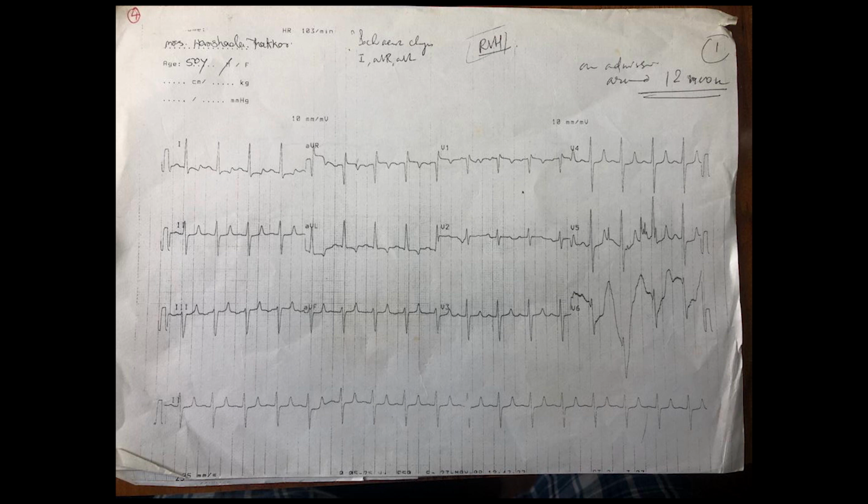negativity is more than positivity. So AVR negative is at plus 30. The pointer at minus 60 will tilt toward AVR a little bit, because AVR negativity is slightly more than positivity. So it will be less than minus 60. The axis would be around minus 45 to 50. That again is left axis deviation. The cause of left axis deviation in this case is left anterior hemiblock, or left anterior fascicular block. That's all. Thank you.